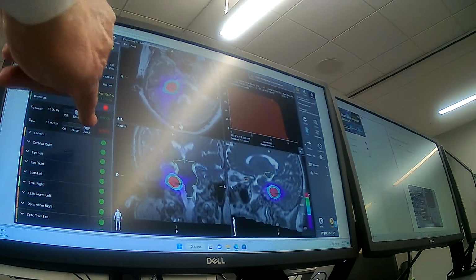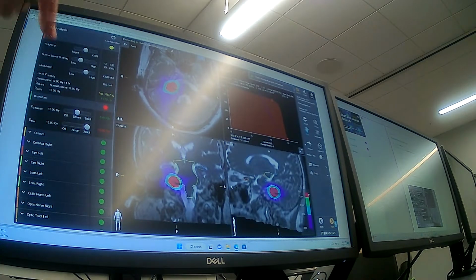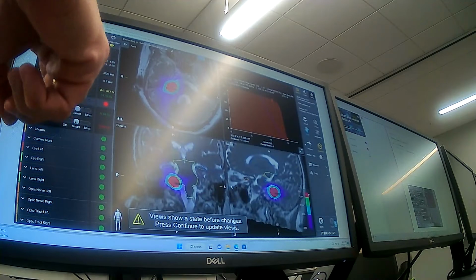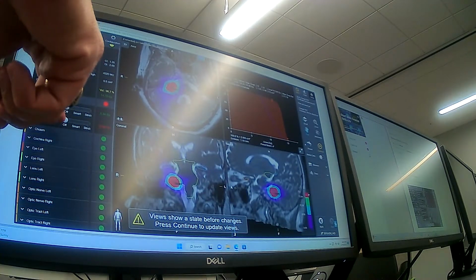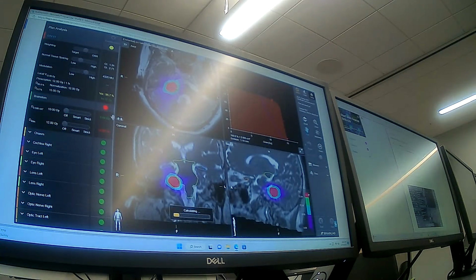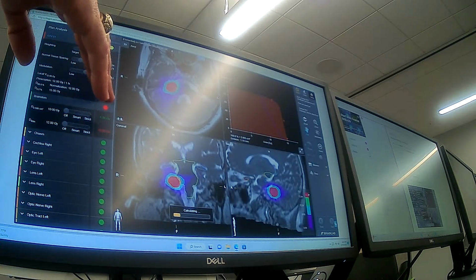You see, so this is where it's trading off right there. Yeah, so move that to off. Just move this to off, put them both at off. Okay, now optimize. So it ignores the brainstem. Yeah. And then see if you meet criteria here.